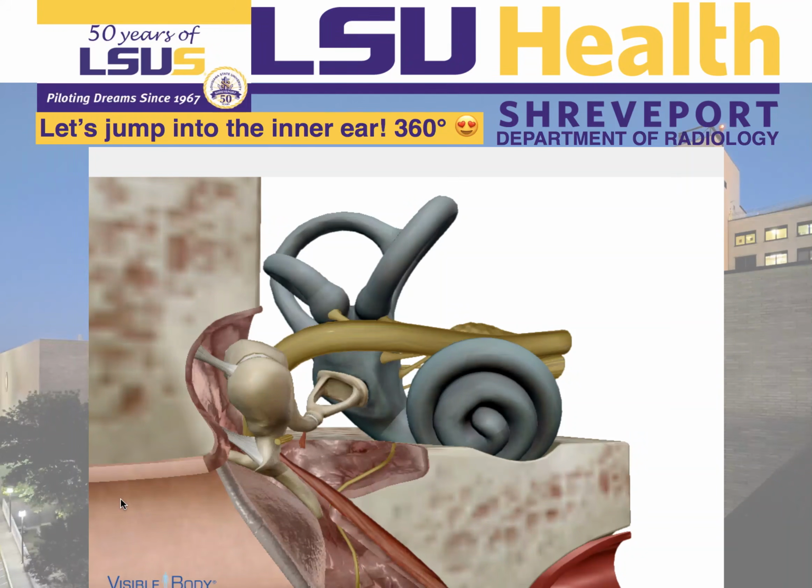Let's make again a quick review of this anatomy. This is the cochlea. These are the semicircular canals. They are connected through this vestibule. Always remember that the cochlea is anterior, inferior, and medial compared to the semicircular canals, okay? Always remember that the facial nerve passes through the inner ear, as you can see here, and on its way it passes under the lateral semicircular canal, as you can see here. Okay?